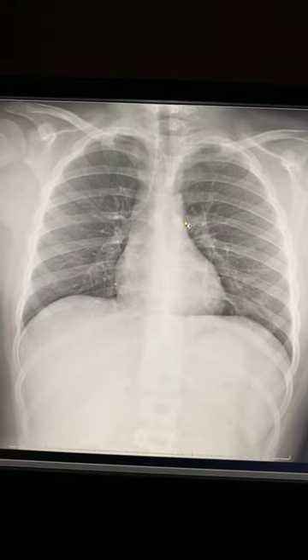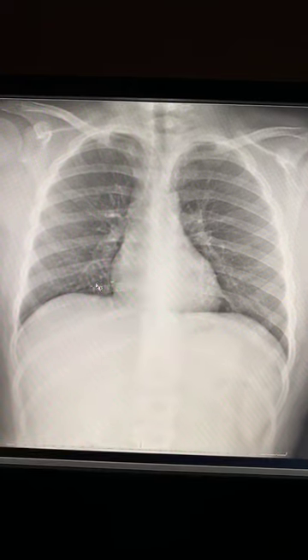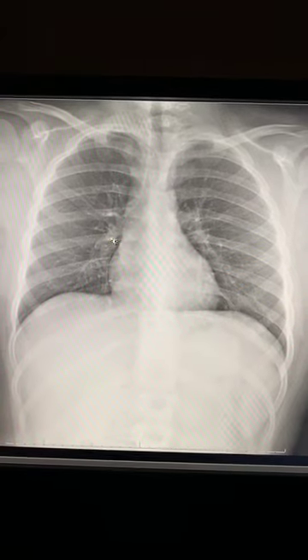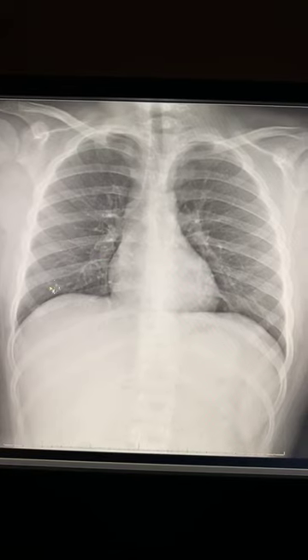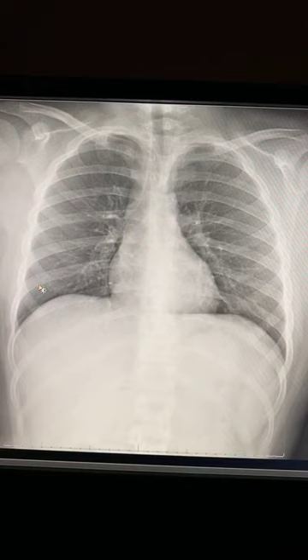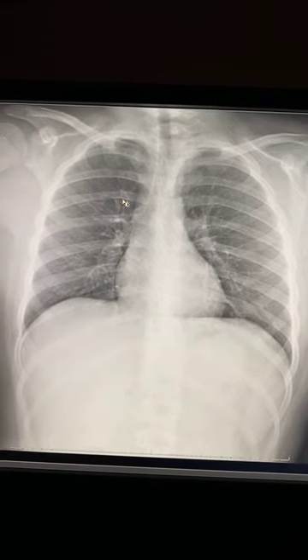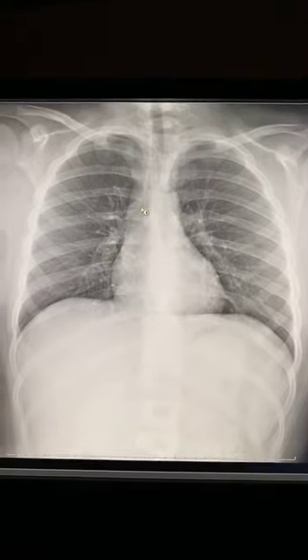Now, quickly, now that I mentioned that, which hilum do you think should be higher than the other? Well, it's the exact opposite of the right hemidiaphragm. So this hilum should be higher than this side. The other thing that I want to stress to you, the pulmonary arteries, the tiny little arteries, should they get bigger as you go down here or should they get bigger as you go up there? Normally, they're going to get bigger as you come down here. That's normal. There are instances where they get bigger up here. We can get to that at some point, but that's not normal. It may be normal for the patient, but there's something underlying going on that's causing it to do that.